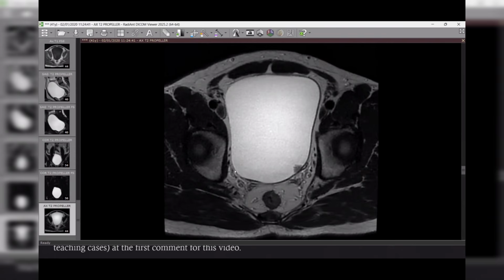As we described before, is it single? Yes, it's single. We mentioned the size before, the ureters, and give me an idea for the depth.